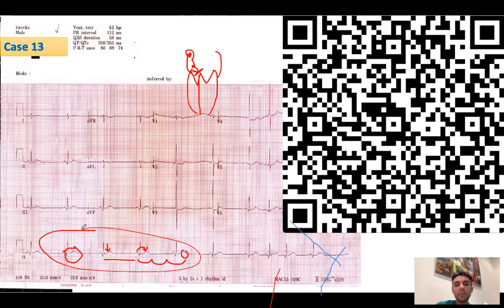Okay. In this case, just to complicate things, the P waves here did not reset the sinus node. So in here briefly, there was no bradycardia, because this PAC blocked before the sinus node, there was no reset. This is an interesting finding. Anyways.